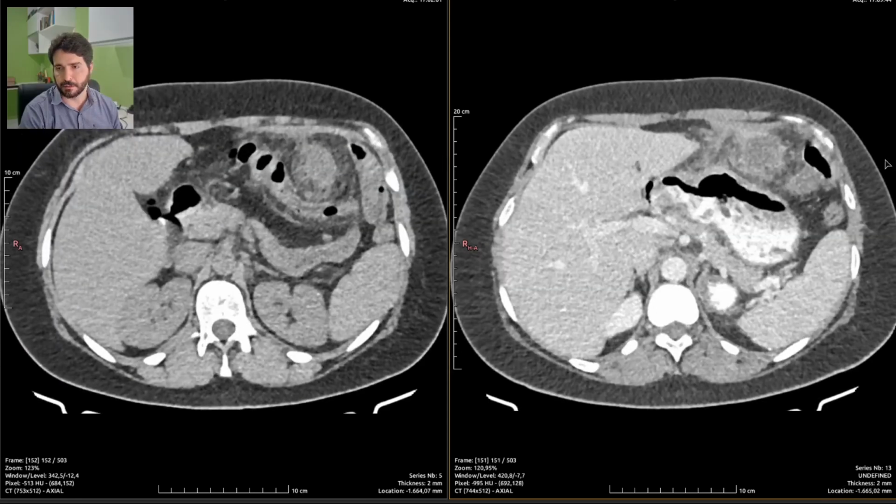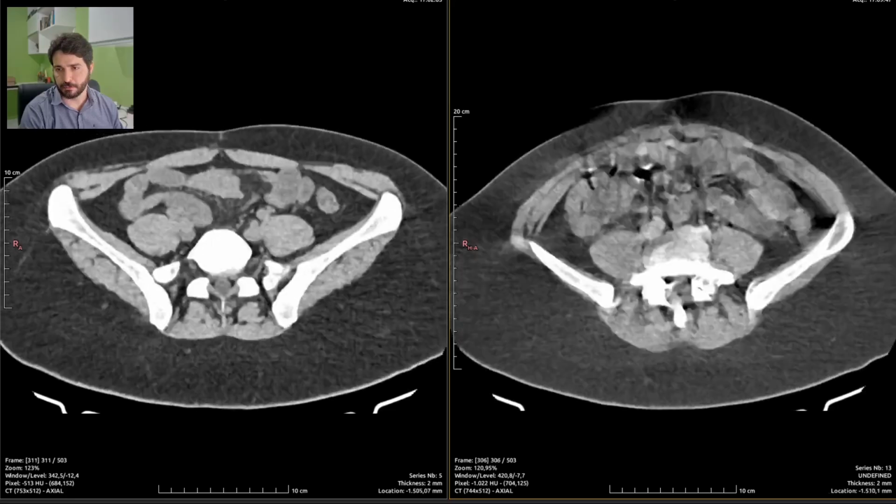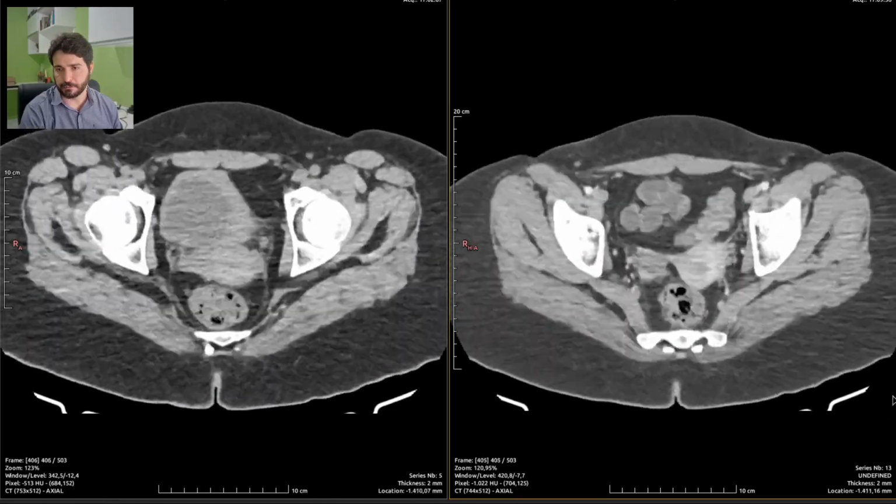So this is the cause of the pain. This is most probably what the doctor is looking for.